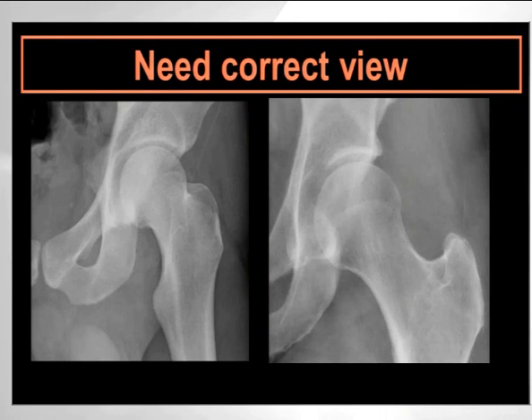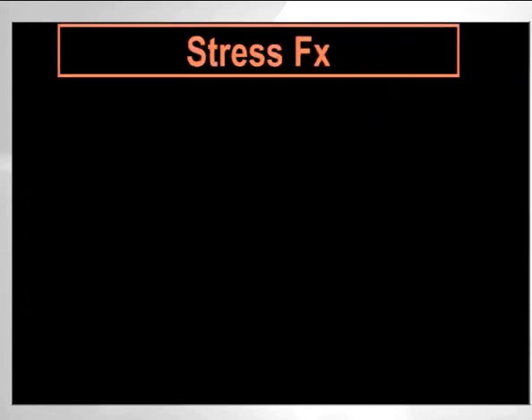And you need the correct view. So don't compromise if the patient is externally rotated. You need to see the neck like a light bulb. So you need to have internal rotation.